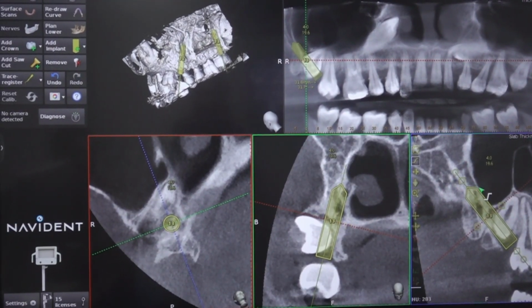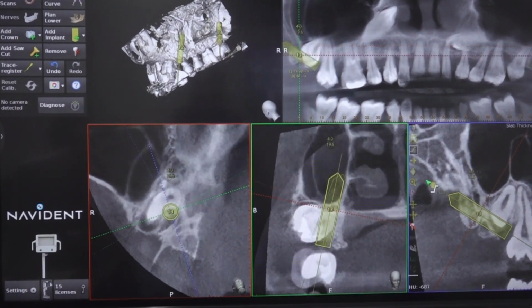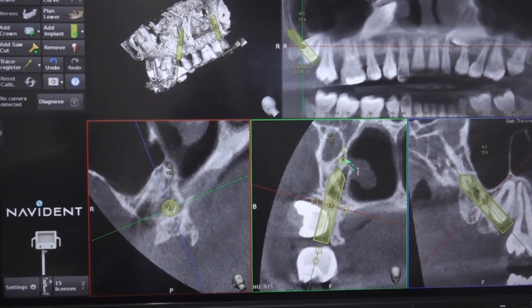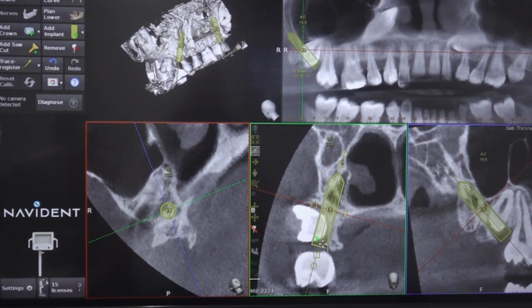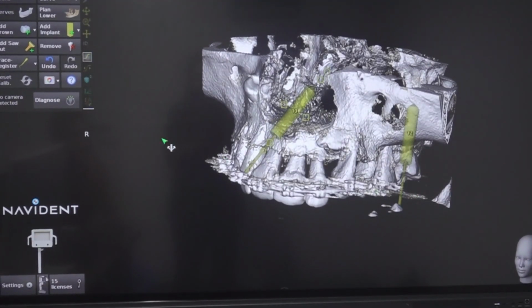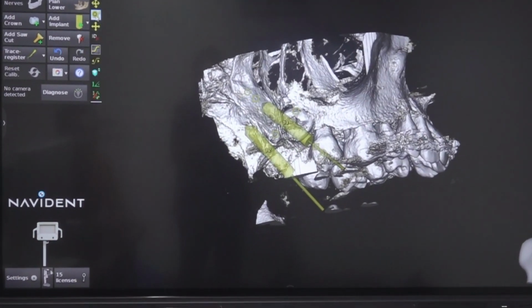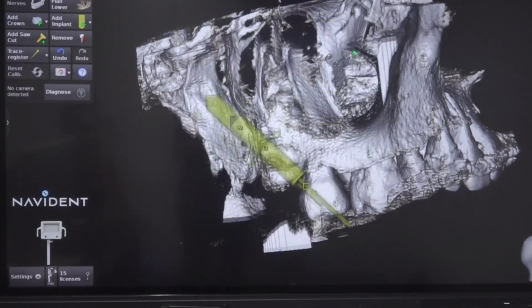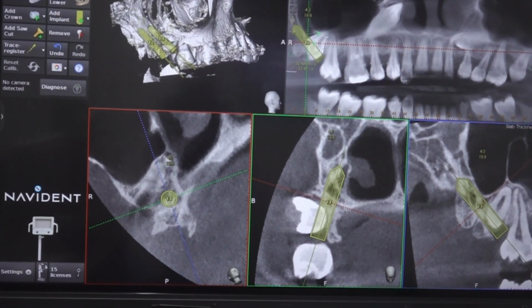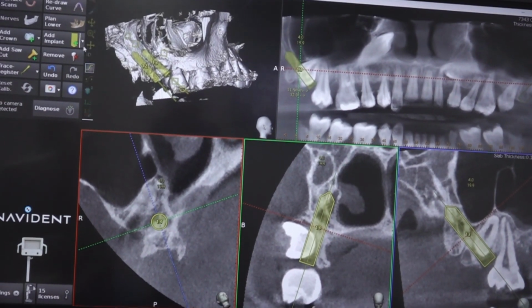The more vertical you are inside the sinus, the more horizontal you will be on the less bone area. So it should be in between. This is the important trick. So we will see the 3D reformed view. So the right side pterygoid is over. While removing, we should be careful not to push it into the sinus or pterygoid space.